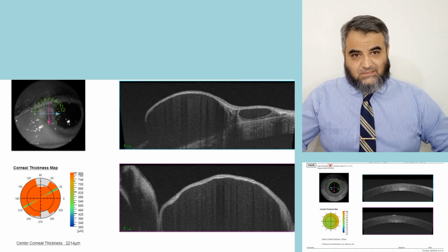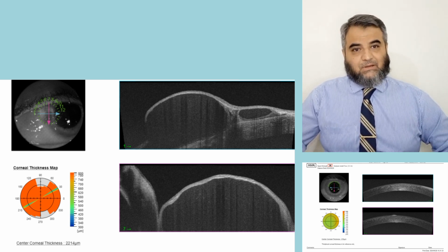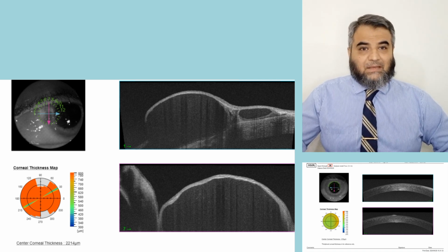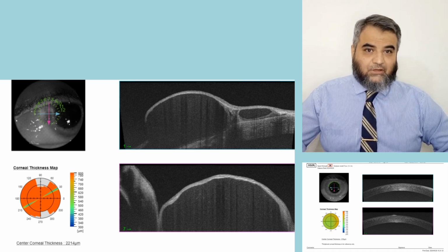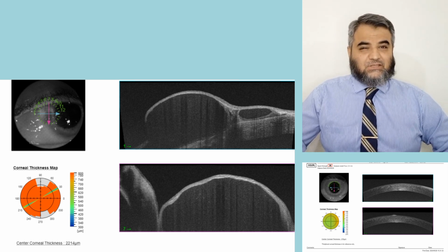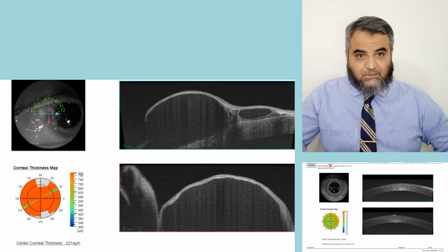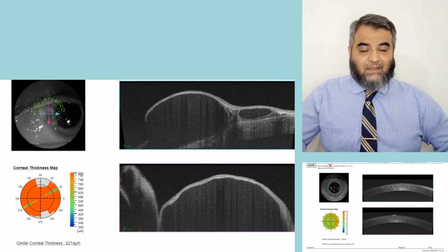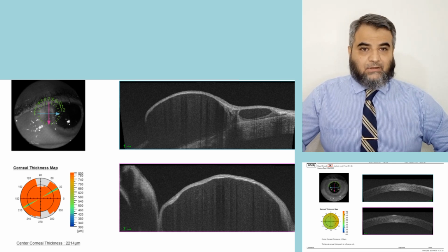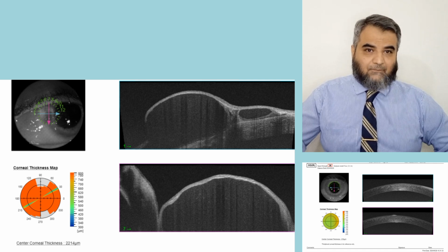But in cases with atypical presentation, OCT anterior segment, the imaging devices, are very helpful to rule out the element of malignancy, that is, whether it is a benign lesion or it is going towards malignancy. Especially, the conjunctival epithelium is continuous with the corneal surface. There is no abrupt change on the cornea. And secondly, there is no deep penetration in the cornea. So these things point towards a benign element in these photographs.